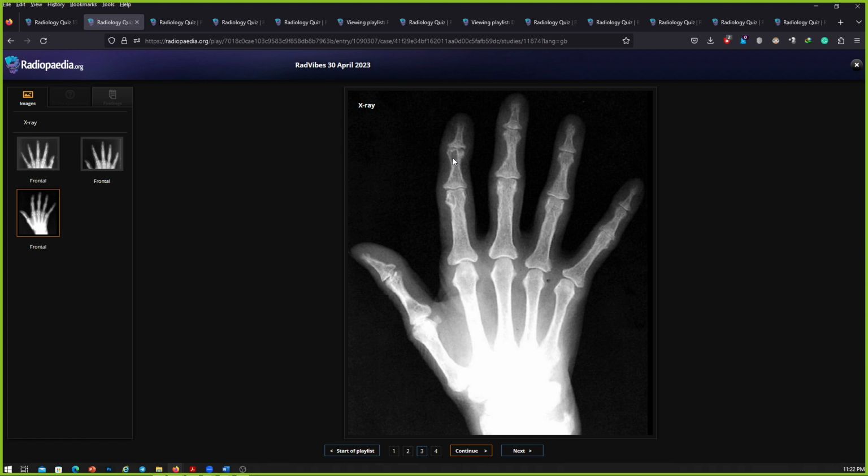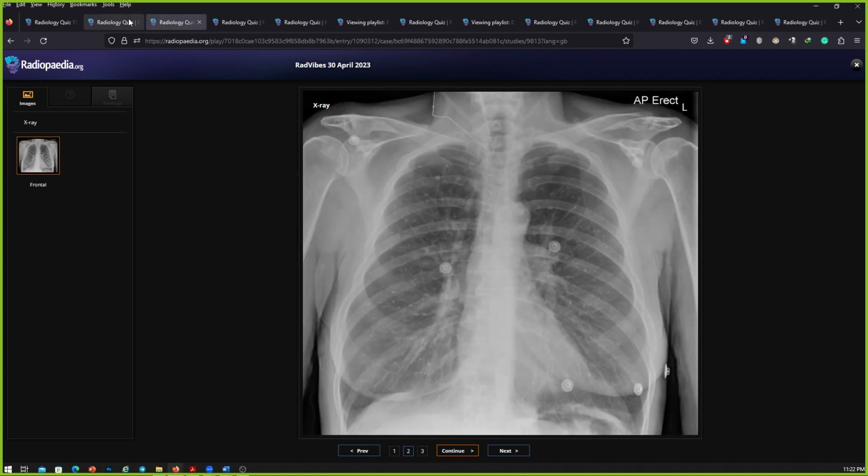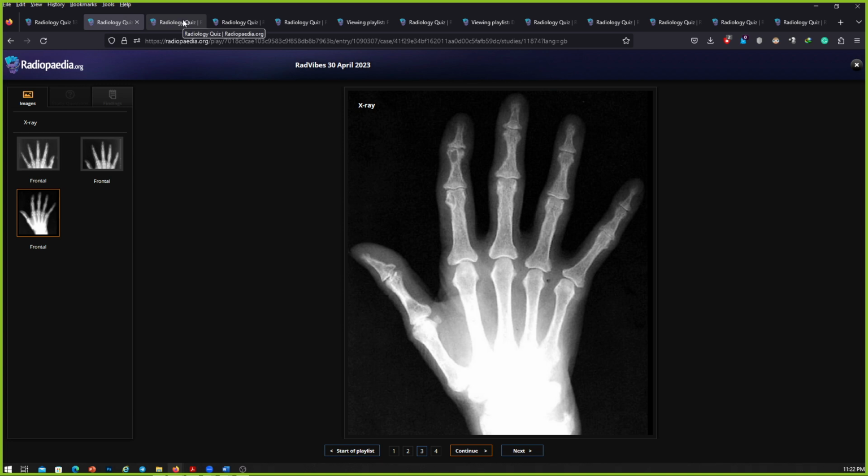So all these things you have to describe in almost all the tumors that you see, even if it's a benign looking tumor as in this one. So this is a brown tumor with subperiosteal resorption, and this is a case of hyperparathyroidism. This is spotted in most radiology board exams, so you have to know this.